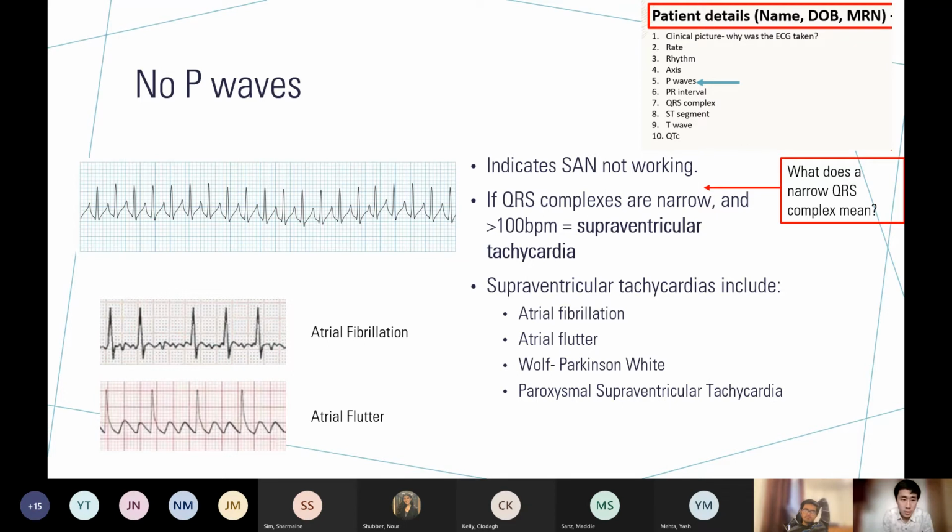Very good. Atrial fibrillation on top. You can see those fibrillatory waves. Sometimes they're not so obvious. Flutter below. Fantastic. You've got clearly here these sawtooth sort of things instead of the P waves, which symbolize atrial flutter. So fibrillation and flutter are slightly different.